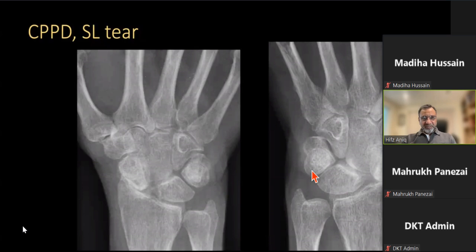What happens, as I mentioned, what is this structure between the scaphoid and lunate? Ligament, the scapholunate ligament. Exactly. So the scapholunate ligament is prone to tear because it becomes hard very quickly. Yes. And then what happens to the space there is that it just subluxes in that area. And that leads to osteoarthritis, of the carpal row, or basically all of the things.